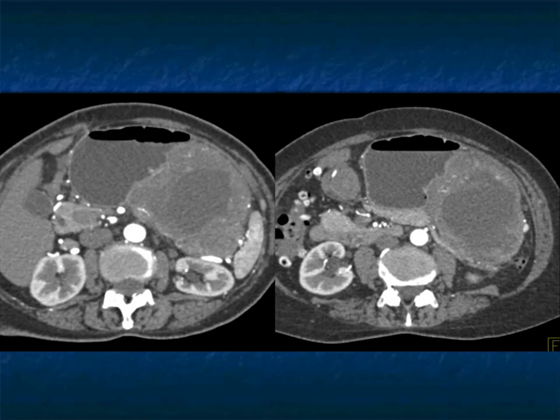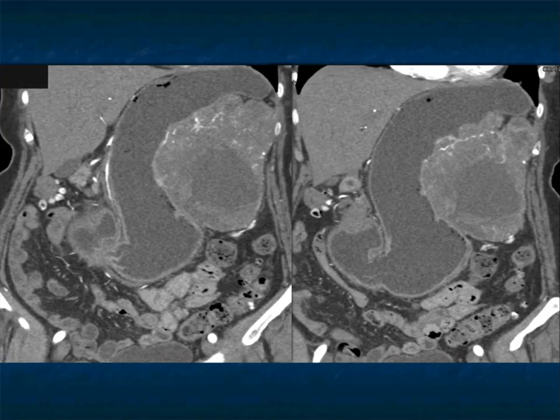GIST tumors are interesting because although they can grow intraluminal, for the most part they're large exophytic masses, can be 20 or 30 centimeters in size. Most are 5 to 8 centimeters. They can present with bleeding. They can present with mass effect. And at times, in this case, maybe not. In this case, it's surely coming off the stomach. In other cases, it's not so easy.